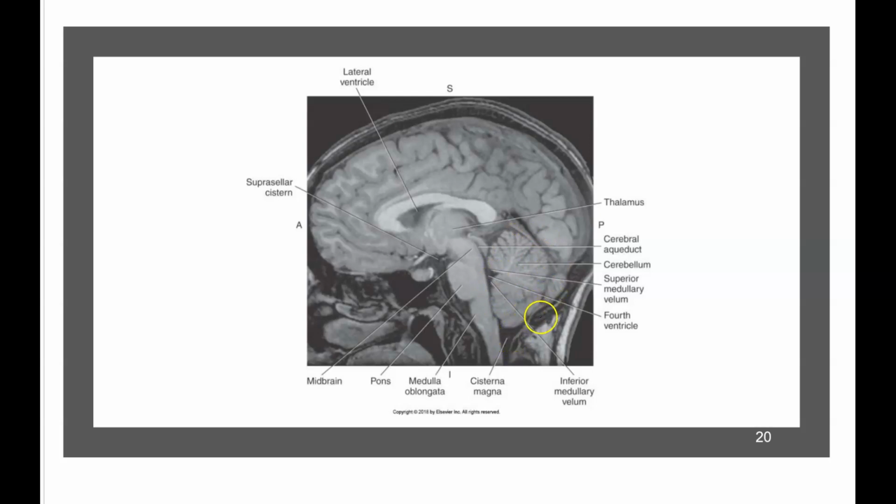Here below, so here's your occipital bone. So let me draw this in for you right here. So your occipital bone comes down right here. So this is your occipital bone. And then you can see that you have your foramen magnum right through here. So this is the opening, okay? So you have your cerebellum right here. So your cerebellar tonsil right here, so this portion right here, if it's too much lower than the bottom of the occipital bone coming across, then it's called Chiari.